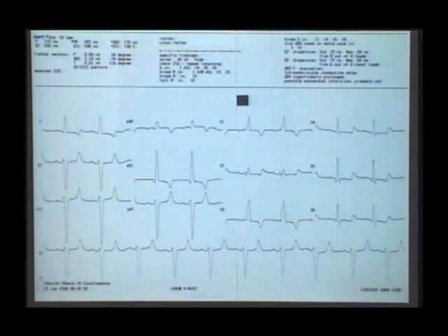So now this has got a QRS widening, isn't it? This ECG has got what? QRS widening. So once there is a QRS widening, what must you think? What bundle branch block is this? Louder. Right bundle branch block. So what I told you, whenever you look at the right bundle branch block, what must you immediately see? See the limb leads. What's happening in limb leads? Left axis deviation, initial small positivity and terminal negativity. So what fascicular block is there? Left anterofascicular block is there.